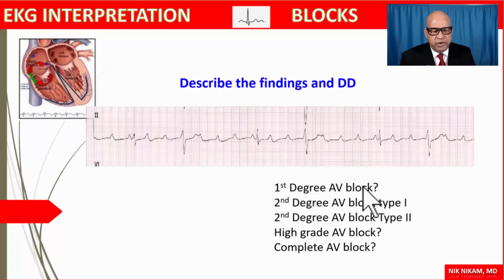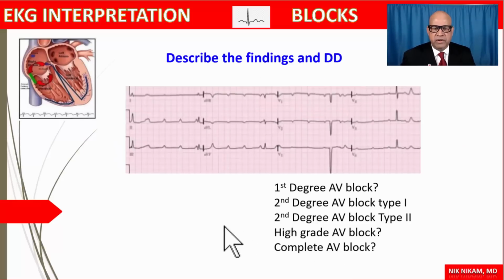Unless you think about each one of these choices, the chances of rushing to a quick answer can result in a wrong answer. Next, what is your diagnosis?